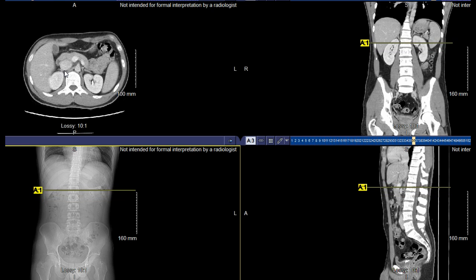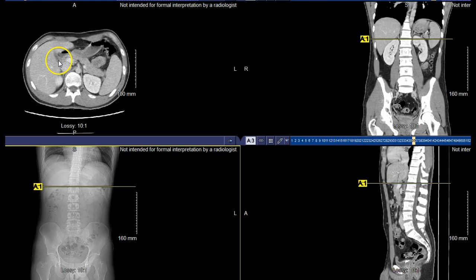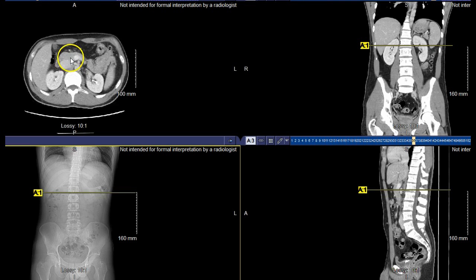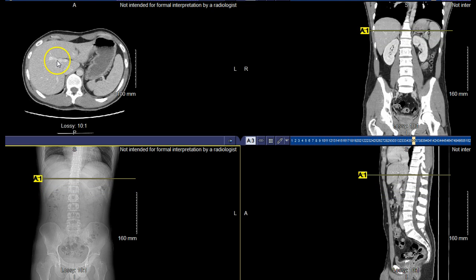The other vascular-based structure that I really wanted to emphasize was the portal vein, and you can actually see that structure right in here. So you can see it quite well. You can see how it's carrying over there respectively. So portal vein is one to note. You can see, like I said, where it's at pretty well here. So in a slice like this, be prepared to be able to identify a portal vein, be able to identify the IVC and the abdominal aorta. So you can see those respectively there as we channel through.